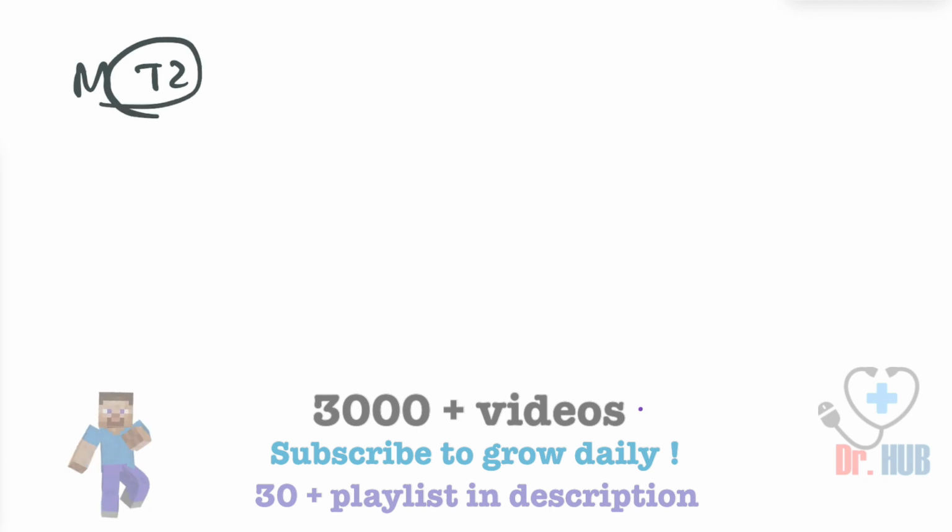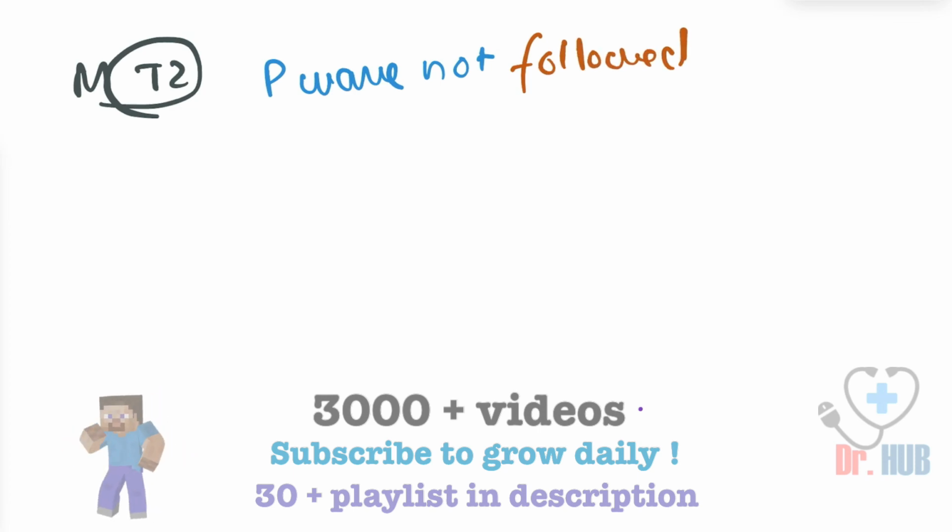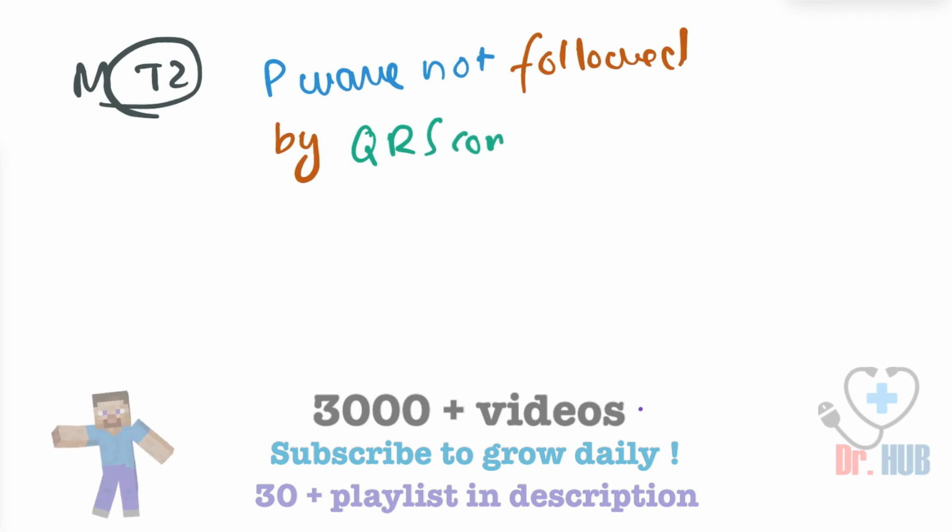In terms of the Mobitz type 2, the P wave is not followed by the QRS complex in some beats.